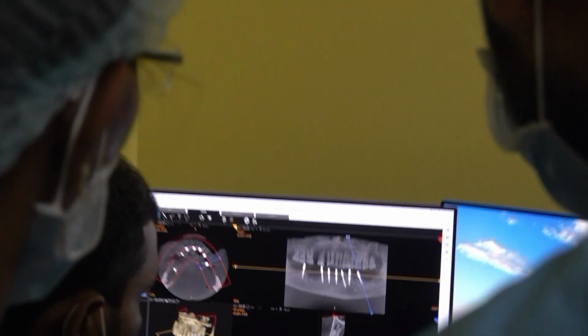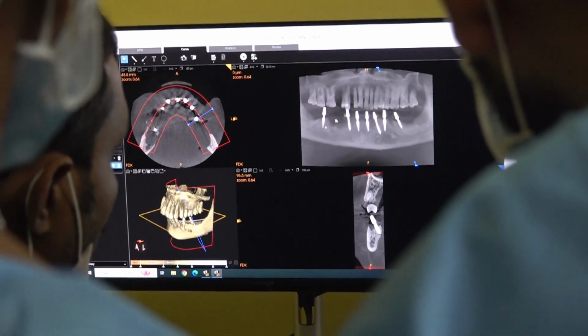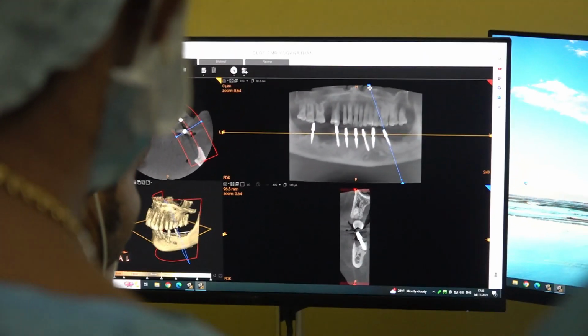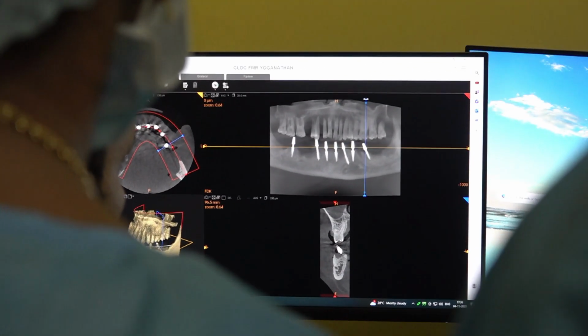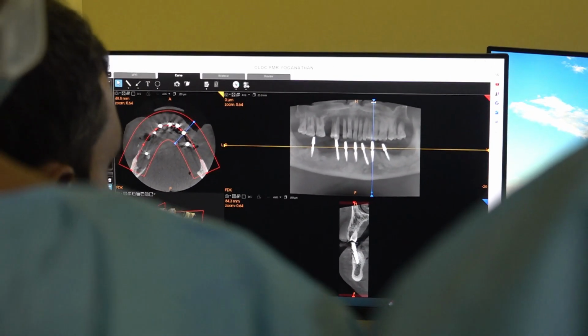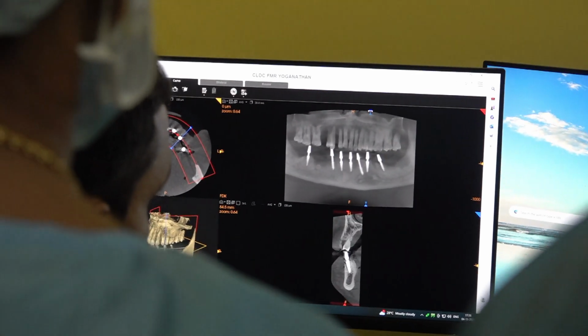This is the lingual cortical engagement. The stability was very good, right? So, you just caution on the pronounced area, like when you talk about the fracture of the abutment neck. Okay, this is the premolar area, no?